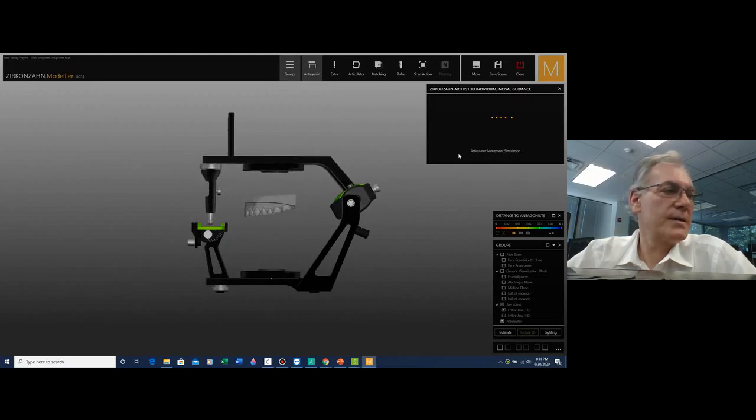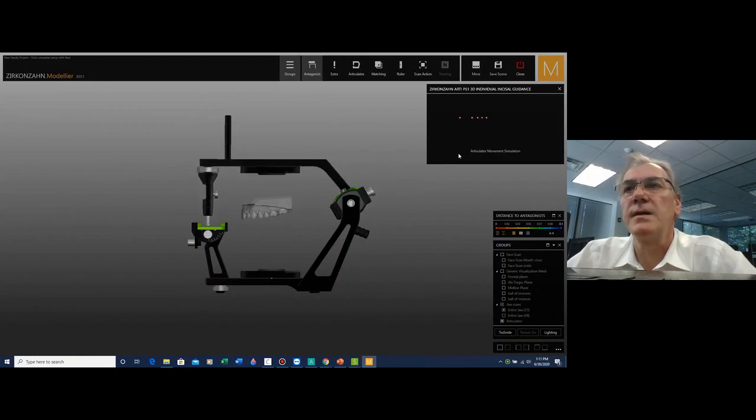Time is getting short, guys. I'm so sorry about that. It does take a little bit of time to perform these evaluations. It's not something that is done very easily, digitally or physically. It takes a little bit of time. It could also be that my computer is just a little bit slow. I probably need to take some stuff out of it in order to make it a little bit faster.